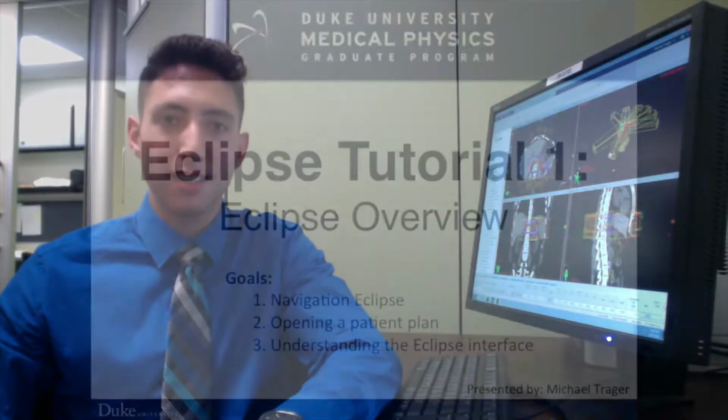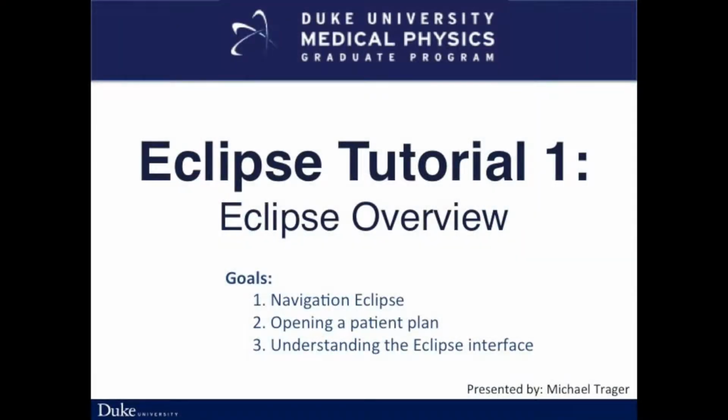Alright, let's get started. This is the first video of the Eclipse tutorial series, Eclipse Overview. In this video, I will discuss how to navigate Eclipse, open an existing patient plan, and discuss the interface of the External Beam Planning functionality.